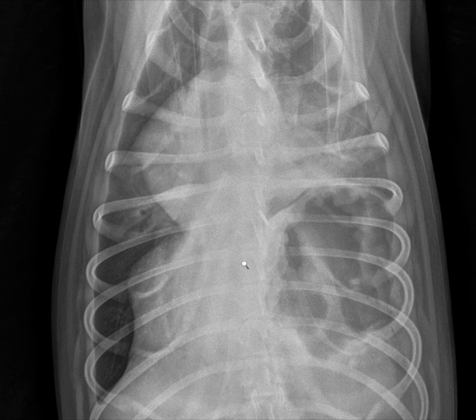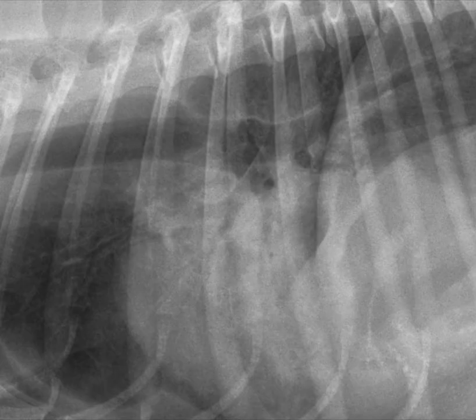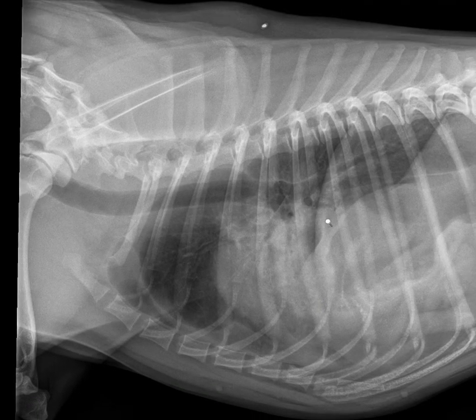This is relating to this pathology here, which we can finally get to now that I've looked at heart and lungs. So you can see that there's a large gas opacity with kind of curved margins located in the left caudal thoracic region. This is highly consistent with cranial displacement of the stomach. When we look at the lateral view, you can see that there's this bulge associated with the diaphragm that goes cranially and that it indeed does contain part of the stomach.